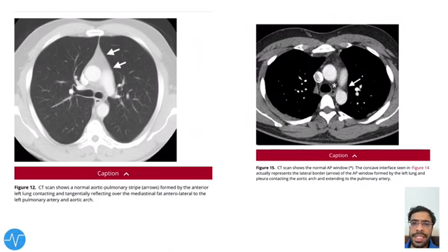On the left, the double arrow mark is showing the aortopulmonary stripe, which is a line which we can see, but the window is the cross mark, the star mark which you can see. That is the window between the aortic arch and the pulmonary artery, and in front is the ascending aorta and behind is the descending aorta. Boundaries which we have seen.